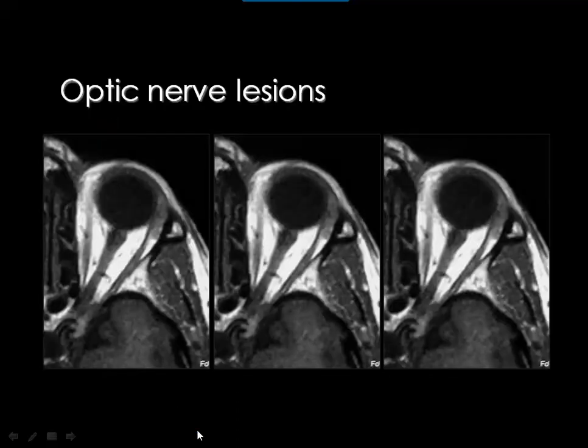Then, to start with, how to diagnose an optic nerve pathology. If you see a lesion like this, which is almost encasing the optic nerve, going along the course of the optic nerve, this is an optic nerve lesion. But if you see a lesion like this, also masking the optic nerve fibers and also having the same direction of the optic nerve, consider it as optic nerve pathology.